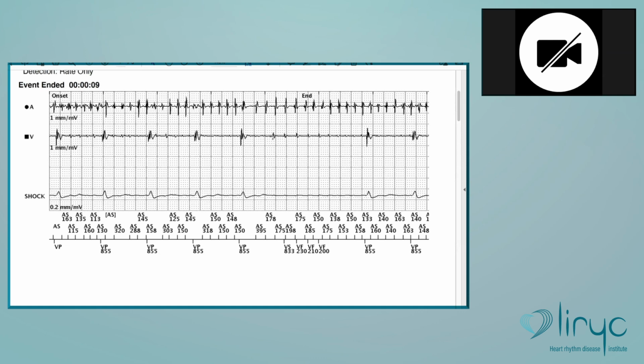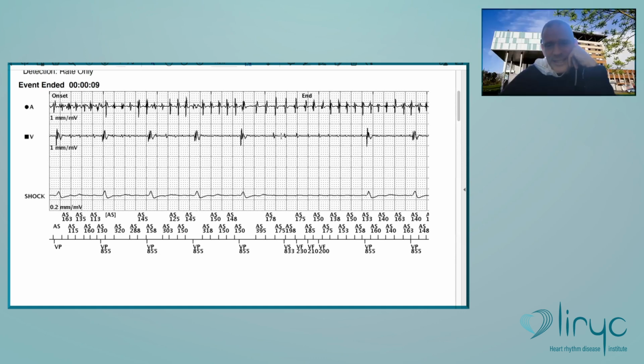Second, if the patient is dependent, then you will not see one spontaneous real ventricular signal that will reset the level of sensitivity. If you sense one small signal, the device will work with very low sensitivity. The nominal value is 0.6 millivolts, and you will work all the time at 0.6 millivolts with a high risk of oversensing the next signals.